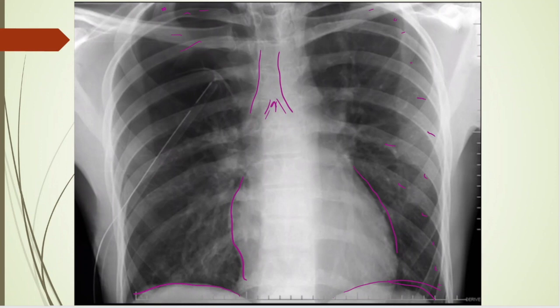But you look here on the right lung, right off the bat you can see a chest tube. So here's a chest tube. And up here you can see a lack of vascular lung markings. Look how you don't see any lung markings up here. Yet down here you see the vascular lung markings pretty well. So you can see this patient still has a pneumothorax even though they have a chest tube in. You can see the pleura right here. It looks like it comes down here actually.